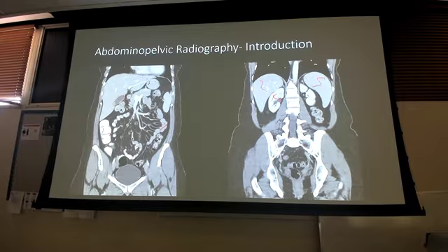That's the gallbladder. Notice how it's more radiolucent. Why is that? Well, I got a bunch of contrast going on here. The gallbladder's got nothing inside. There's no tissue. It's just this hollow organ filled with liquid or bile in this case, right? So it's not going to obtain any of that contrast because I don't have vasculature like I do going through the liver here. I don't have any of that going into the gallbladder because it's a hollow organ, right?